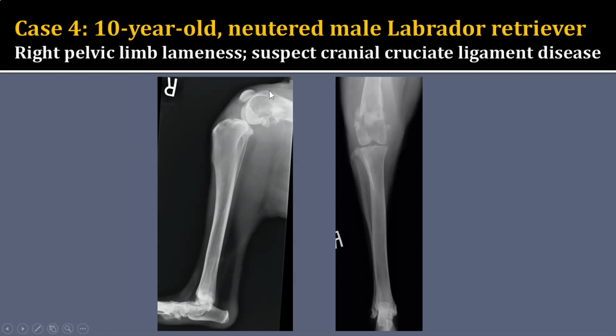Notice that there are areas of cortical lysis cranially and caudally. This patient has some periosteal reaction on the medial and lateral aspects of the distal femoral diaphysis and metaphysis. It looks fairly solid and smoothly marginated. But then on the caudal aspect, I see some wispy reaction, so there may actually be some amorphous periosteal reaction. And then finally, this lesion is not very discrete, so there is a poor transition zone or long transition zone with poor margination.